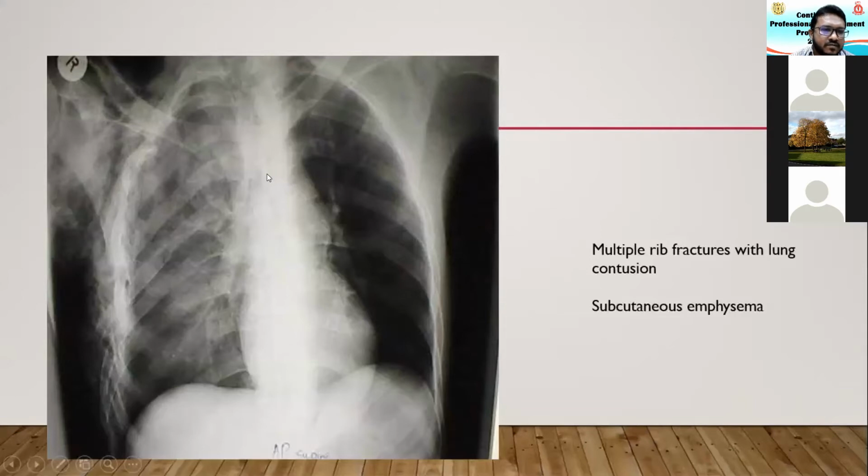And there is not much of a mediastinal shift. You can't see a lung outline, so there is no real threat to life at this moment. And there is not much of a pneumothorax on that side either.